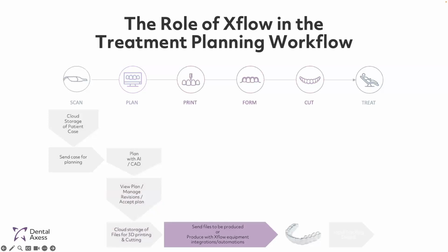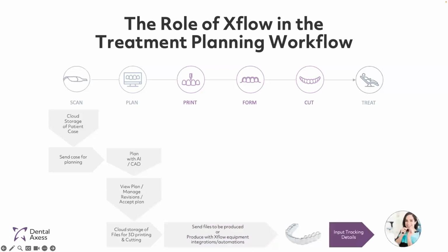And then from there, you have the ability to send out your files, these production files, to a third-party lab to design for you, or you can design yourself with our integrations within the platform. So the whole production workflow from design approval to 3D printing and cutting is all seamless, and it connects directly to the manufacturing equipment to streamline these production tasks and ensure traceability in your processes.